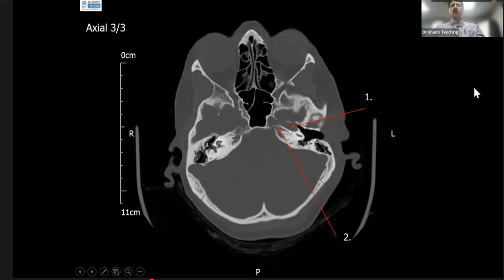It's a bit harsh because there is a bit of partial voluming, but there is a canal here. So what is this? It's not a continuation still of the carotid canal, no? Yeah. So this is the carotid canal, and this is the horizontal portion of the carotid canal.